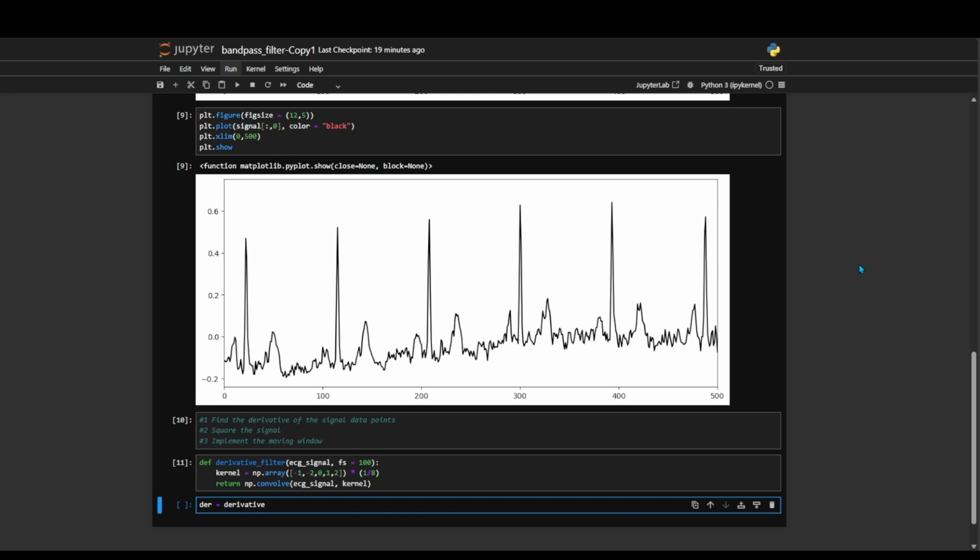Let's apply our filter. If you don't understand where this reshaped data comes from, please watch the first video. Frequency 100.